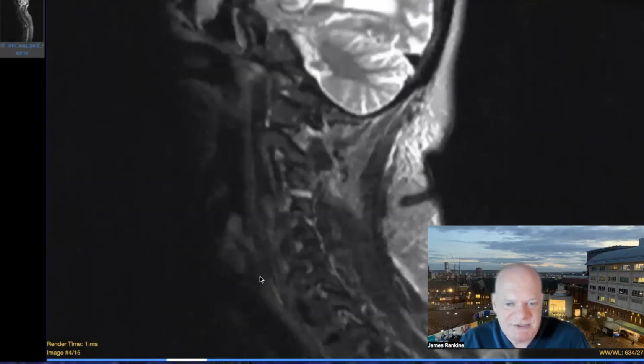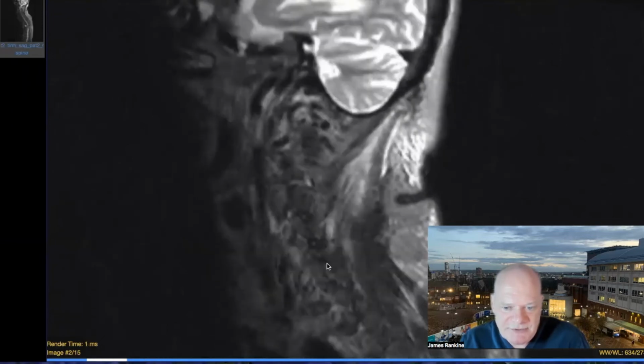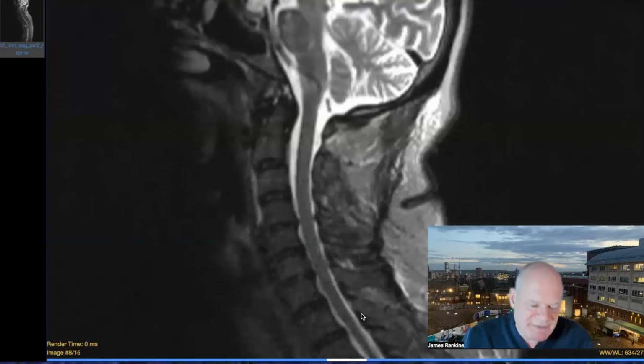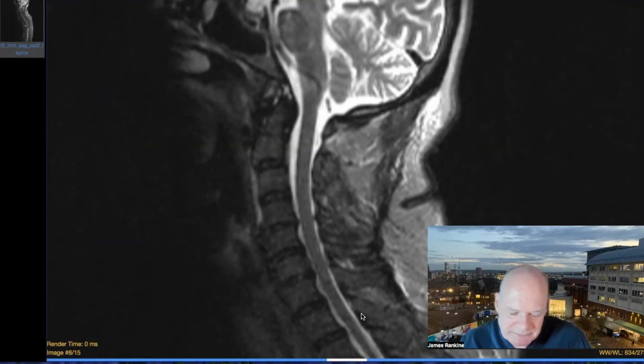And again, I can just look at the parasagittal adjacent to the facet joints, no edema. There would be marked edema there if there'd been a distraction force at the back. So a flexion teardrop does not necessarily mean that the ligamentous structures at the back will be disrupted. Now let's move on to case 5.